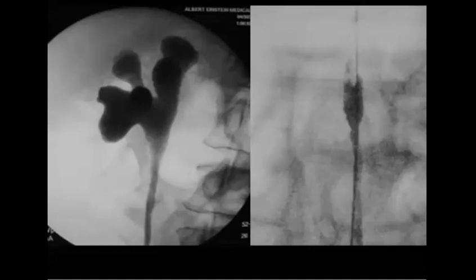Perfect. So in the upper and lower half of the right, there is hydronephrosis, and there is a filling defect at the head of the contrast. It's called a goblet sign. So there is dilatation, but it's distal to the mass. So you can suggest that it is a filling defect, and one of the causes will be transitional cell carcinoma. Okay.